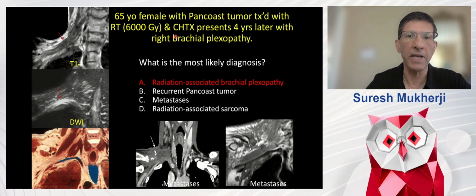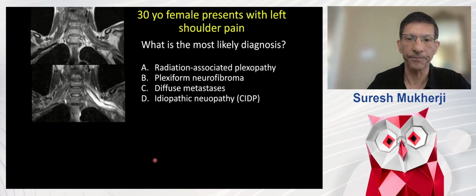So if it was a lower dose and the patient did not have chemotherapy, again, this was going to push me that this patient had metastases.